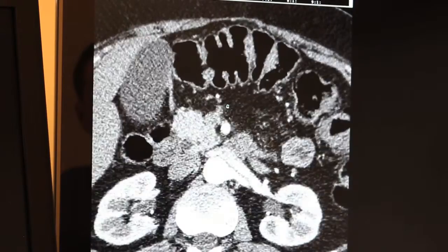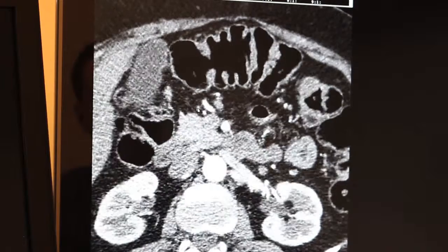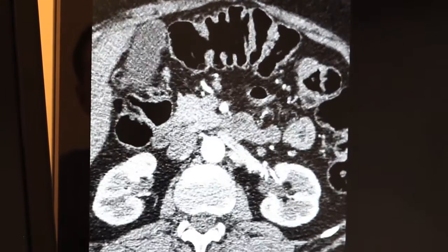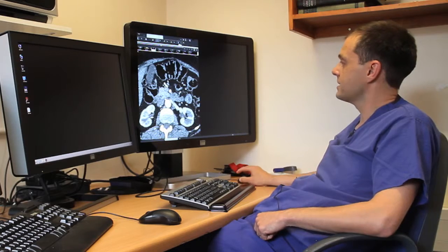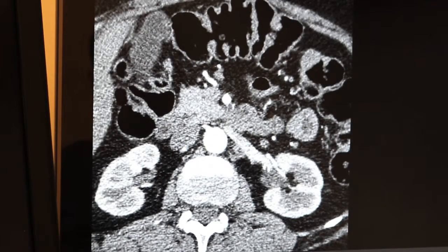So we keep going down, you can see that this right kidney has a small accessory renal artery coming off at the 11 o'clock position from the aorta, and that artery is, just eyeballing it, not wide enough. It's only 3 millimeters at the renal ostium. Doesn't exclude this patient from having the procedure done. The dominant artery is large enough.